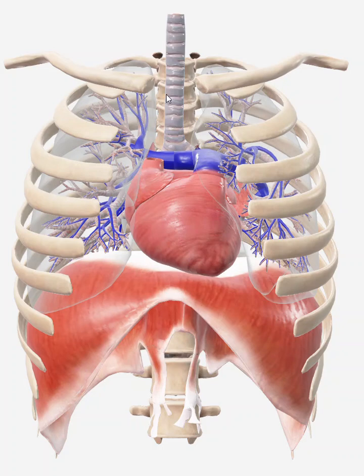What we are looking for, the first thing they've highlighted or labeled on the x-ray, is the trachea. We always look to see where the trachea is. The trachea should be centered on the x-ray. If a patient has some type of pathology, which we're going to talk about later, they may have what's called a midline shift, where the trachea may be shifted to the left or the right, depending on whatever pathology or condition the patient has. But the trachea should be centered.